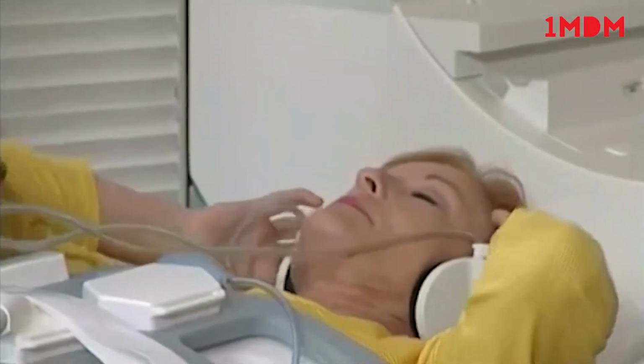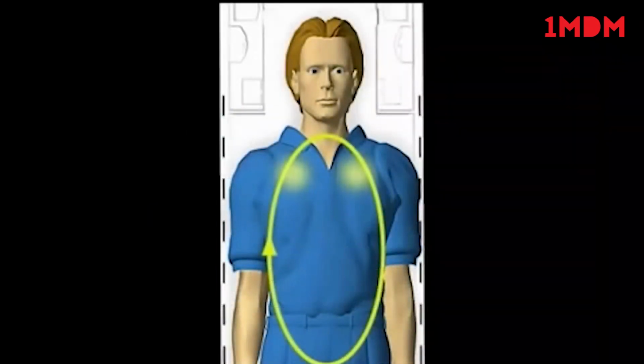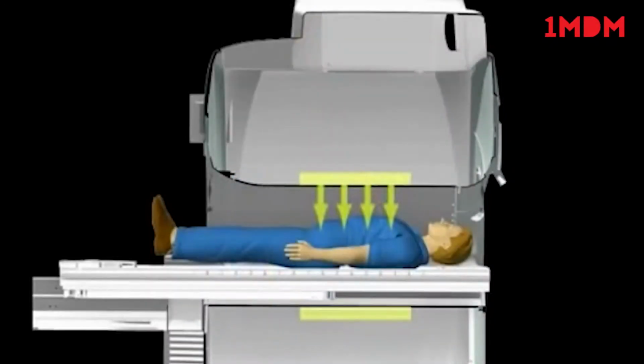In rare cases, quickly switching on and off the magnetic gradient fields can induce electrical voltages in the peripheral nerves. These harmless voltages are expressed as a tingling sensation or mild muscular twitching. However, Siemens MR systems are equipped with safety devices for controlling the switching speed and the strength of the gradients to prevent nerve stimulation.